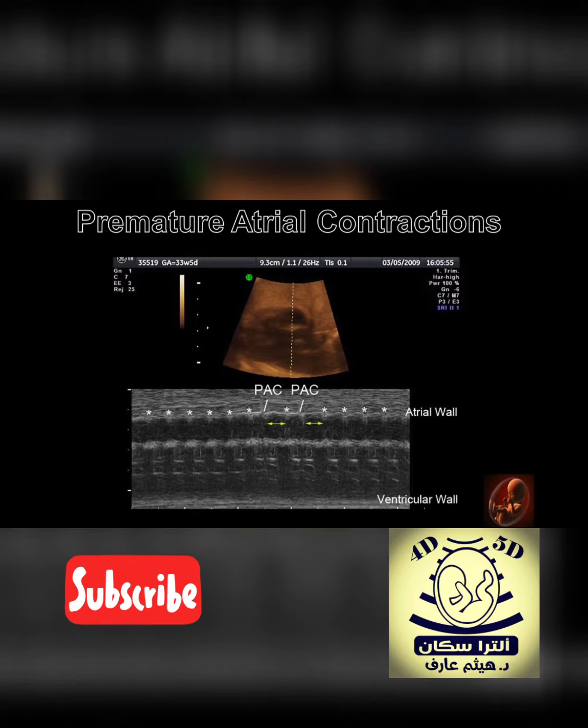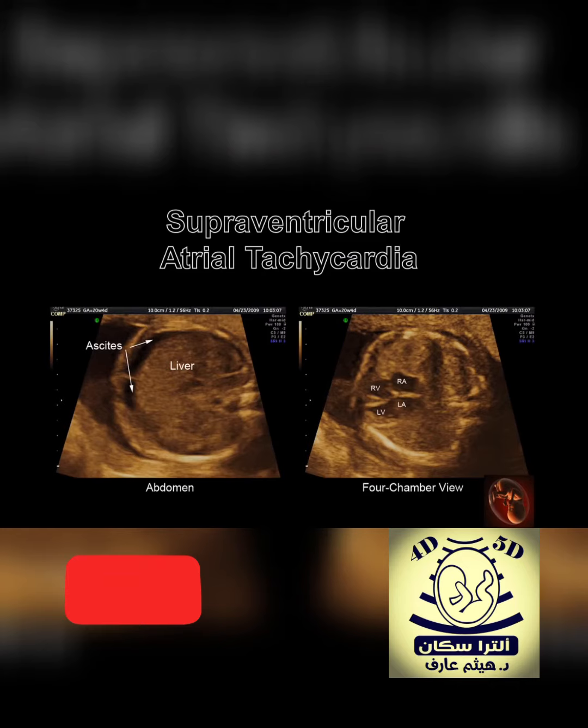This is an M-mode recording obtained through the right atrial wall and the left ventricular wall. Notice the premature atrial contractions are followed by a long pause represented by the yellow arrows. Identification of premature atrial contractions is best accomplished by placing the M-mode cursor through the atrial walls.